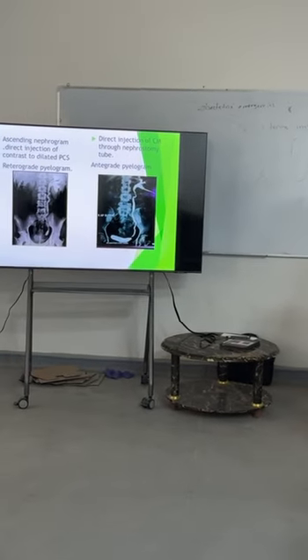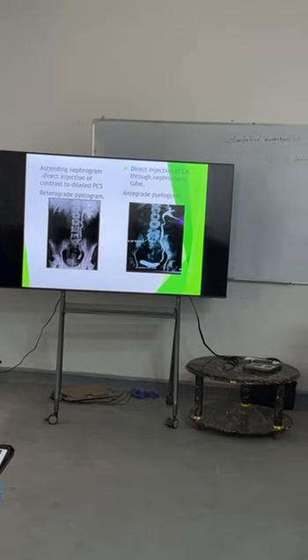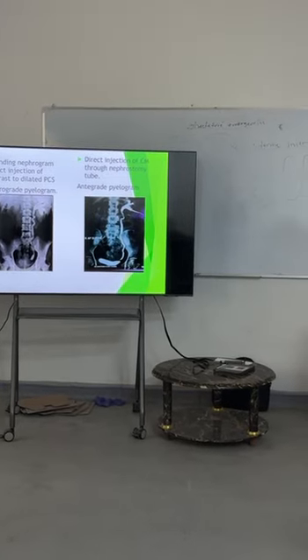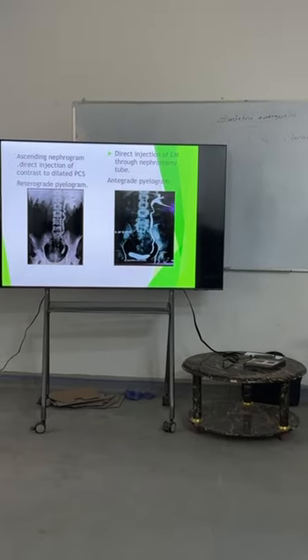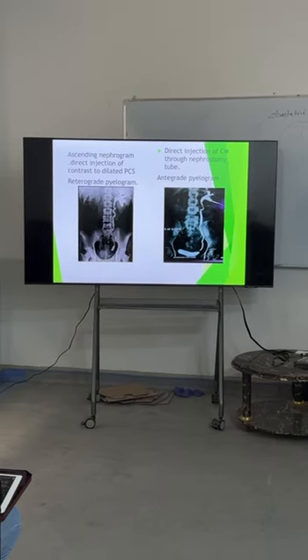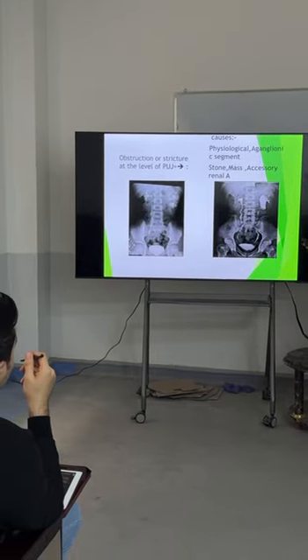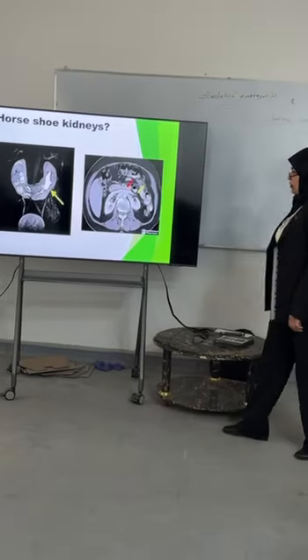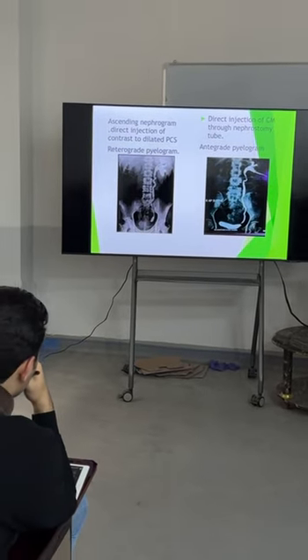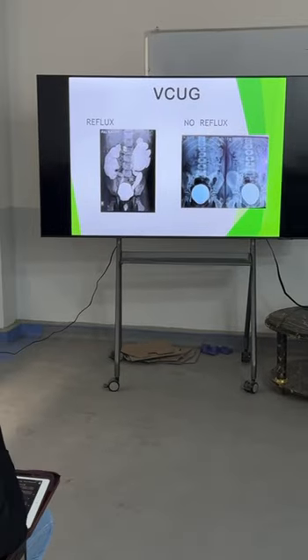In which investigation? Antegrade. And this? Where is the catheter? Where is the tube? Just a minute. Take a look, and then look for this.